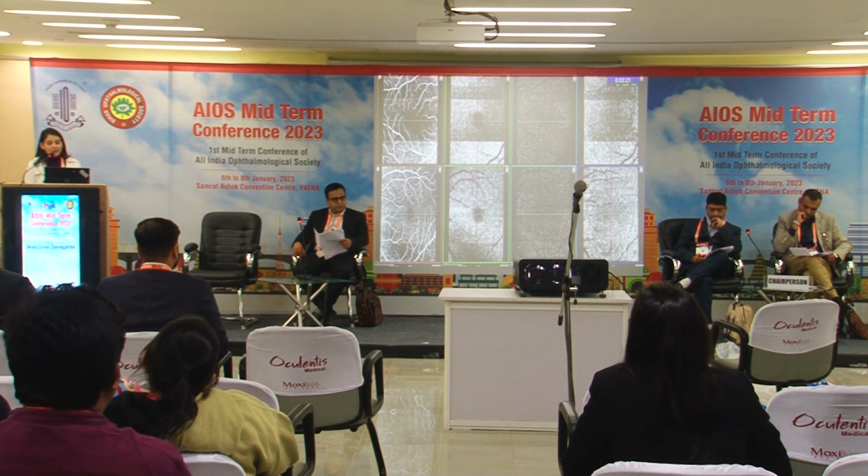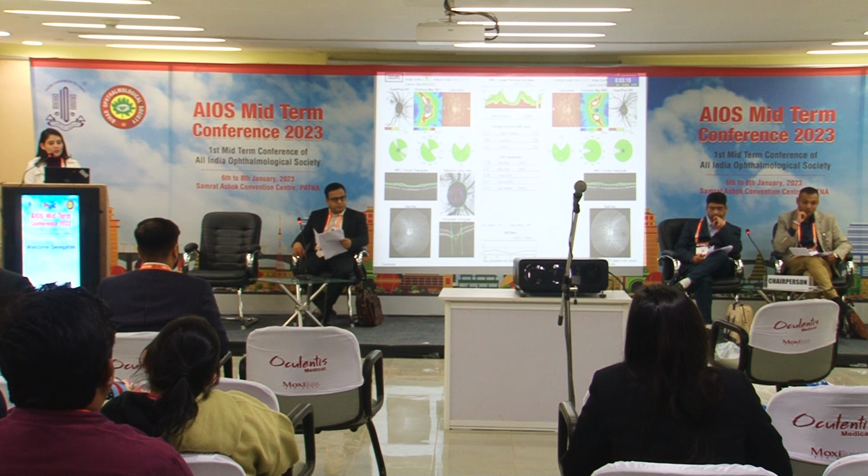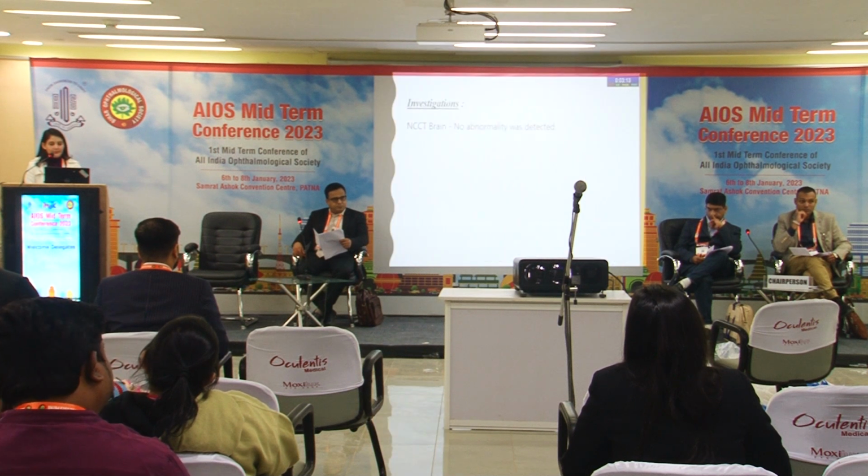This is an OCT angiography of the right eye and the left eye showing normal superficial and deep plexus. This picture shows a normal RNFL pattern. The investigation done was NCCT brain, but no abnormality was detected.